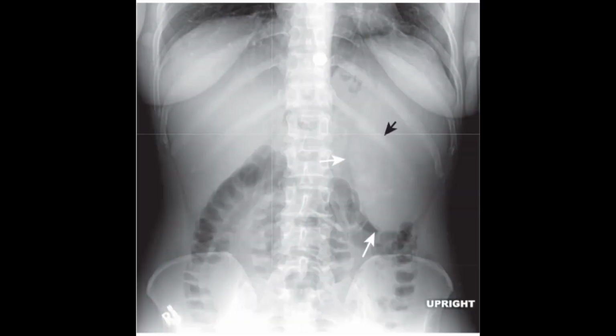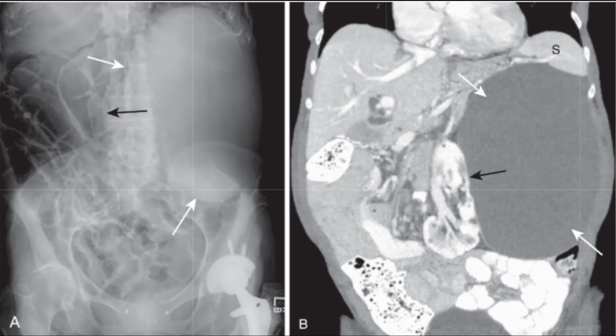Finally, soft tissue masses or enlarged organs may be spotted in the X-ray images, but not very clearly. You can just see some suspicious shadow or some shifted gas pattern inside of the intestine, and this is the indication to look better at this patient and to make an additional examination, such as the CT image that you see here on the second side of my screen, because CT allows us to differentiate the pathologies much better.